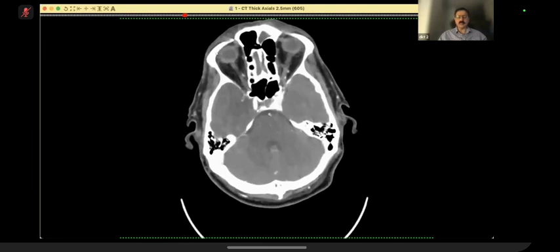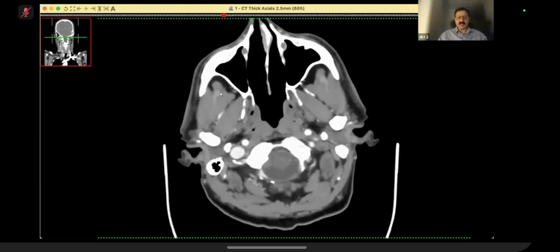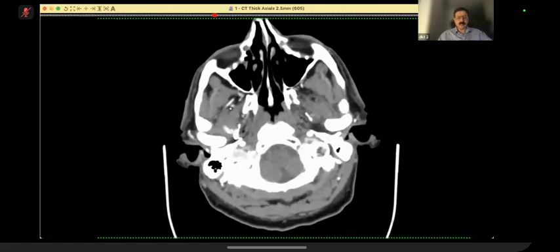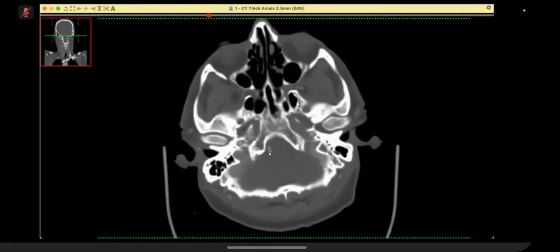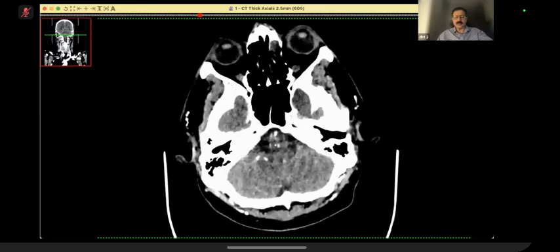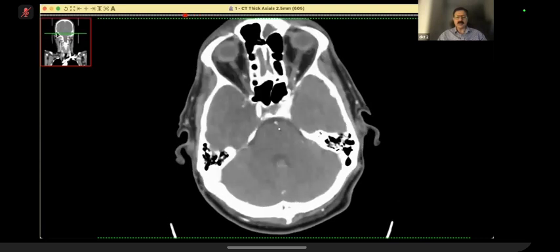And actually he came on an ambulance. And then we did a CTA, and on the CTA we can see the same thing here, just the relevant bit I am showing you. Yeah. So this is a bit of calcification in this region. And if I change the window, sorry, this one, there is a bit of calcification, and you can see here it becomes normal. Here it becomes normal.